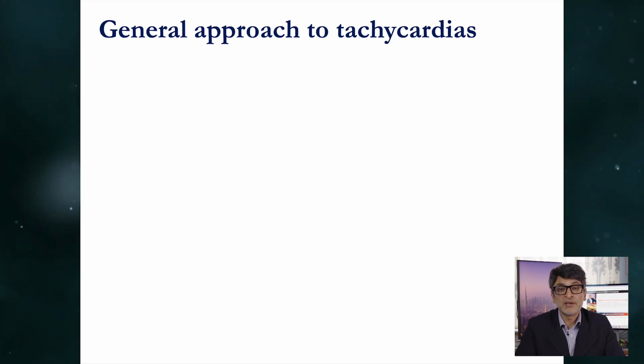And often that's just the patient being anxious in your surgery, understandably, from being undressed, having a heart test that they worry about. And what I would say to you is, if you remember, there is a 10-step system to interpret the ECGs, where we start by the integration. We start by asking you to think about the indications, the demographics, and then looking at the rate as the first step. Now, the point I make is, if you find that the rate is above 100 beats a minute, at that point you pause that 10-step system and move into this tachycardia interpretation algorithm, and I'll talk you through it.